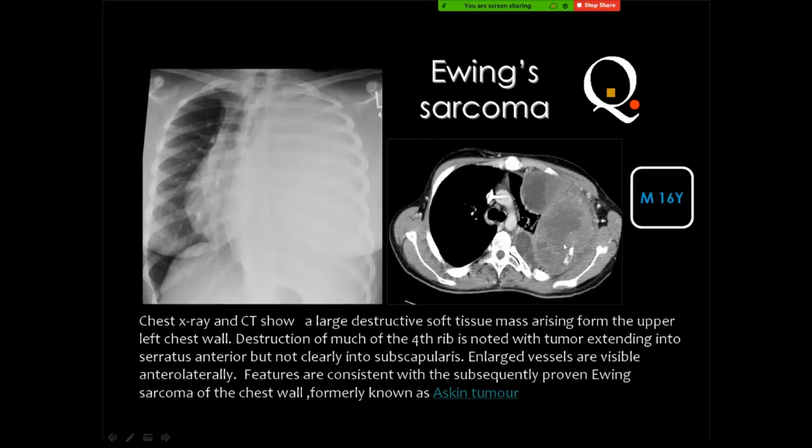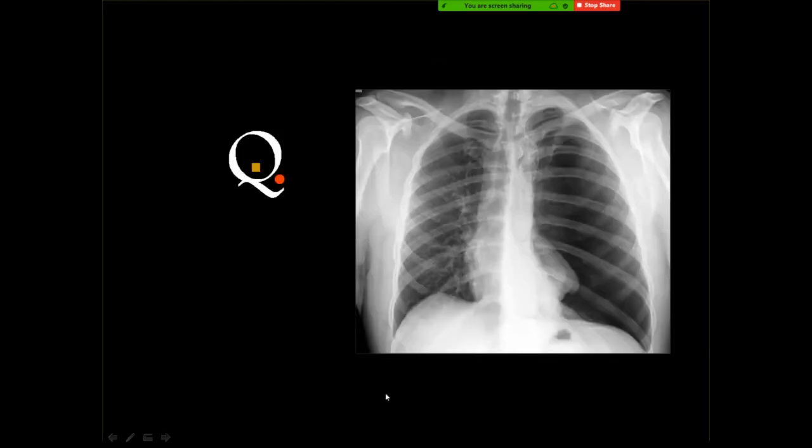But I have recently seen many cases that are younger than 18 years, and they develop bronchogenic carcinoma because of cigarette smoking. But we still stick to the rules that say if you got a mass, and this is actually a mass of the chest wall, not a mass in the lung, because it is almost centralized to the chest wall, then you think of an Ewing sarcoma instead of bronchogenic carcinoma.